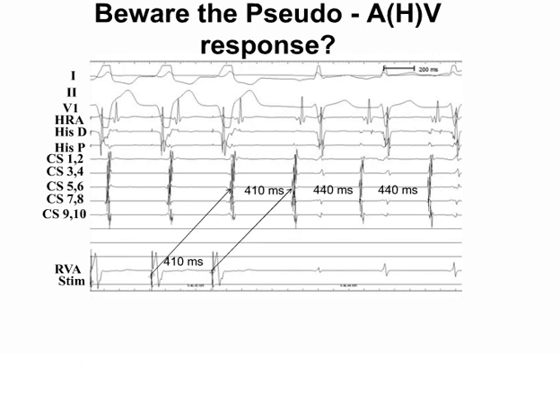So the one that comes right after the pacing stimulus, that's not part of a VAAV. That comes from the second to last pacing stimulus. The last pacing stimulus produces the one where the arrow is pointing to. And so that's the last one driven at the pace cycle length. That's what you count, so it's a VAV. On the boards, they'll definitely show you something like that.